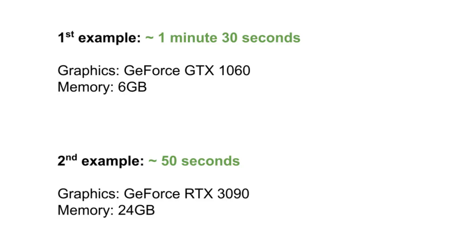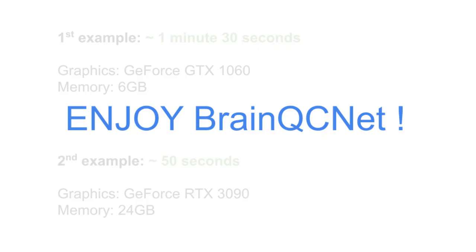So you see that on GPU machines with Nvidia and CUDA installed, our app is clearly fast, depending of course on the memory available and the type of GPU. You may have longer or shorter processing times. So be sure that you have a sufficient amount of memory to run our app. And above all, enjoy using BrainQCNet.